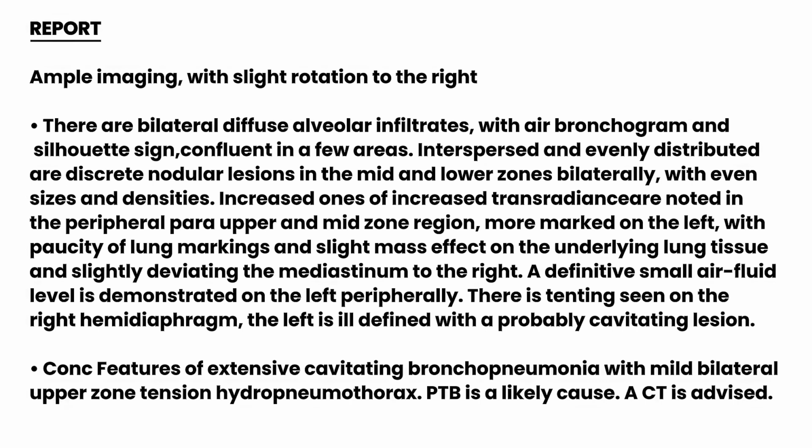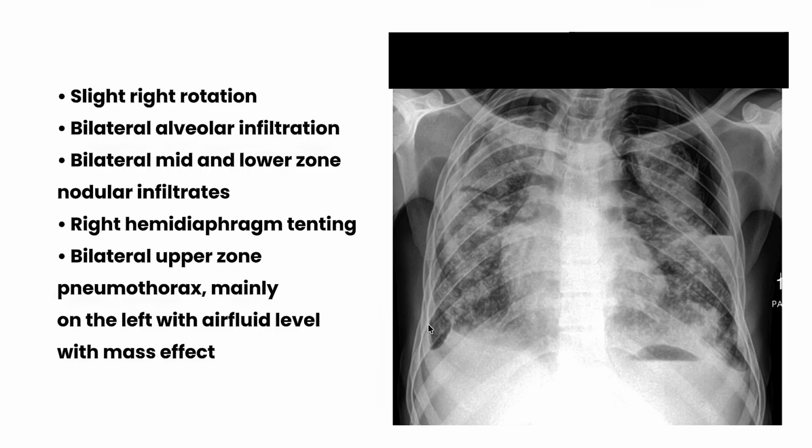Now, you realize in this case, I have derived all the features that I showed up here in this radiograph, and I started by noting one of them, and I don't want any one of them to be missing in the report. So that's why I list them here. And I could go back and forth in my report and make sure that everything that was listed here is in the report.